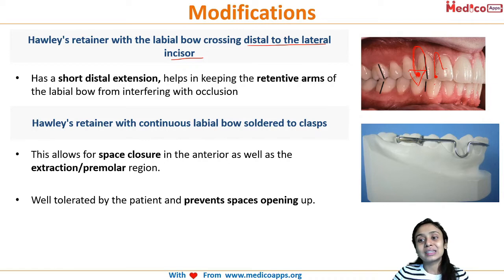So because of this, it is more comfortable for the patient. So this prevents interfering with occlusion. The next is Hawley's retainer with continuous labial bow soldered to your clasp.